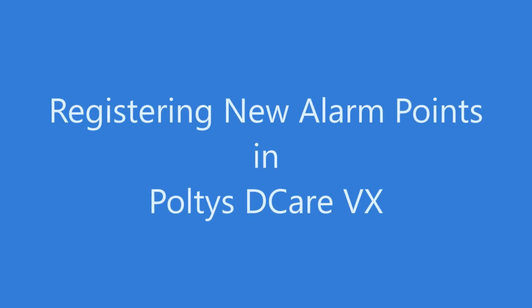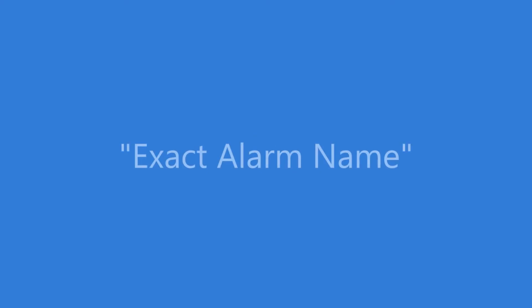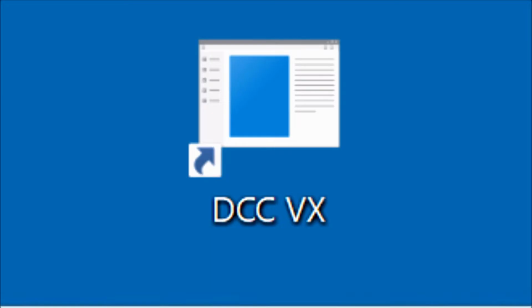The first step is to register the new alarm device through your nurse call system, whether it's System Technologies, VisionLink, Innovonics, or another nurse call system. Take note of the exact name that you use to register it, because we'll have to use that in the Poltys DCC file. If the DCC-VX program is not open, double-click this icon to open the program.